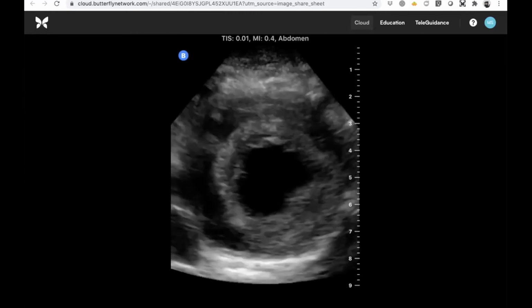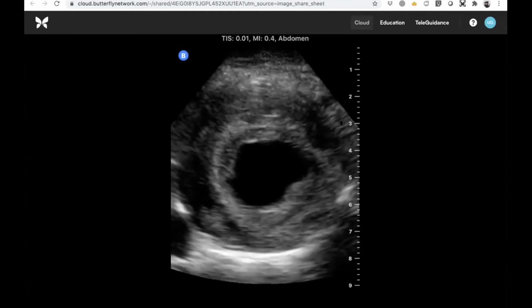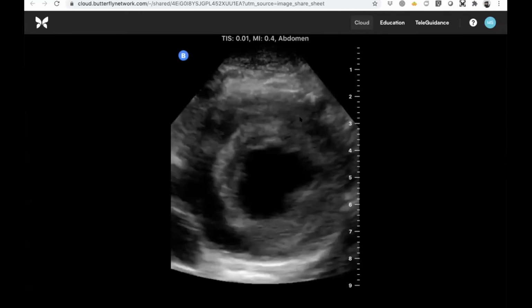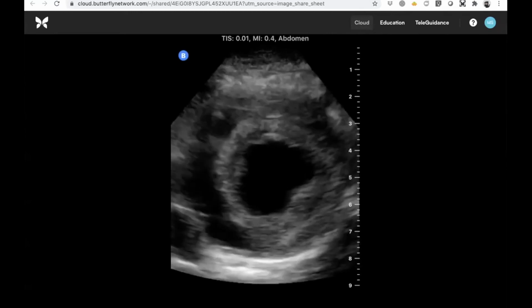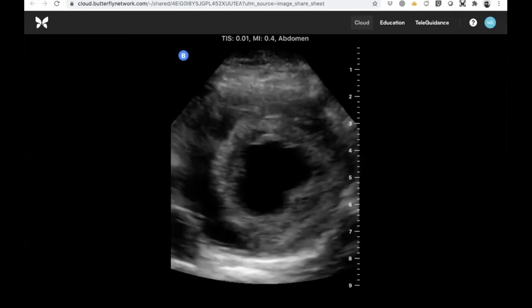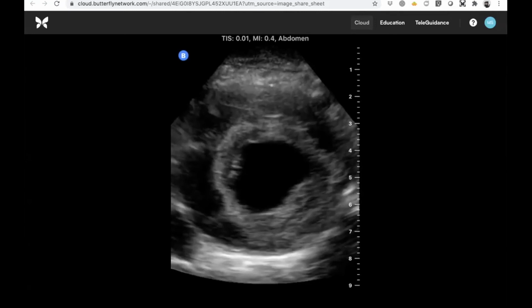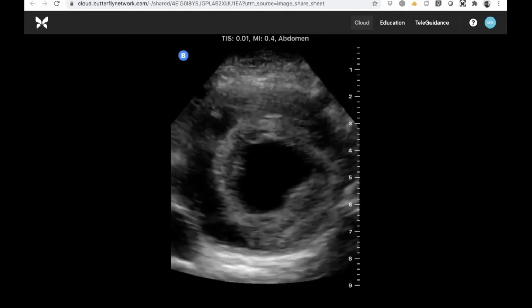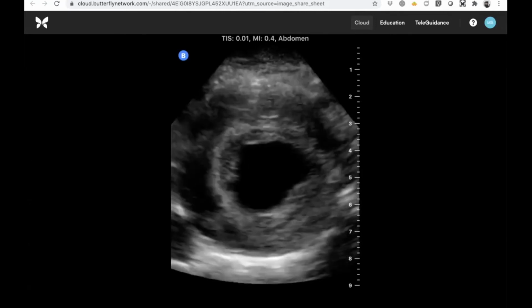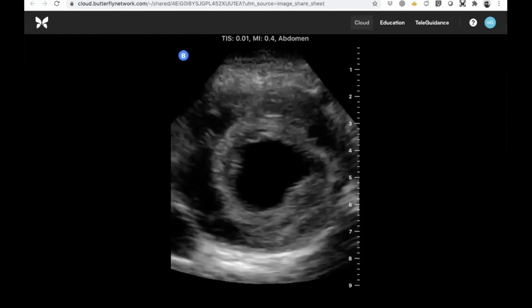And then I think we actually had a comment come in from Al Savage. Hey Al, recommended 2 views, which absolutely, we only had 1 view shared by Brian in this case. We don't have access to the whole study. I'm going to give him credit and say he probably got a long view as well, but definitely whenever you're trying to define structure, 2 orthogonal planes, 2 perpendicular planes, really useful.